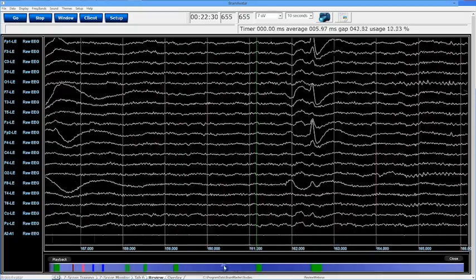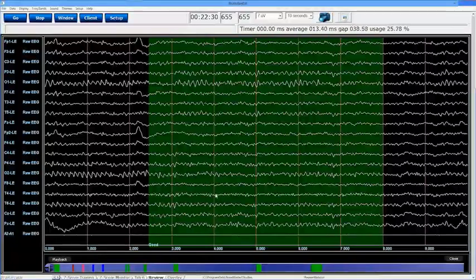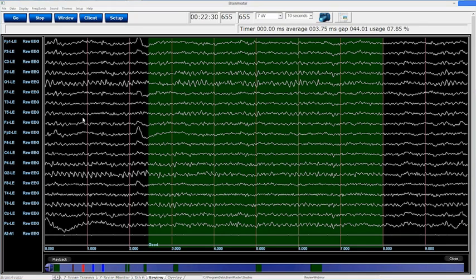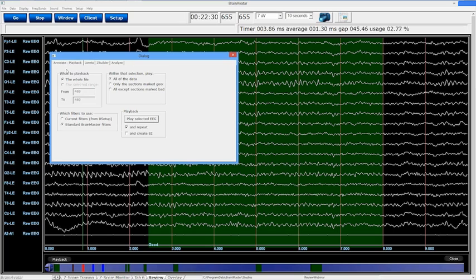All right. Now, the first thing I'm going to do now that I've done this is, I've swept out all these areas that I'm saying are good. And one of the things I'm going to do right off the bat is double click right here. You're going to notice that I double clicked, I didn't sweep an area out, and all of a sudden I'm sampling from 489 to 489, which doesn't make sense to many things. But the reason I'm double clicking is because we built in this feature that basically says, what I want to look at is the whole file, no matter what. So you don't have to sweep out an area and choose between the different things.